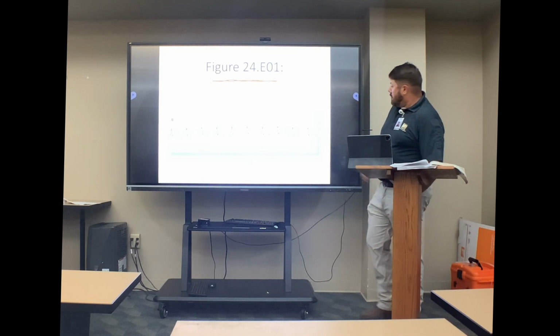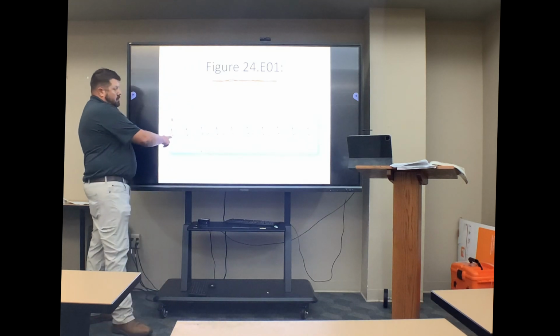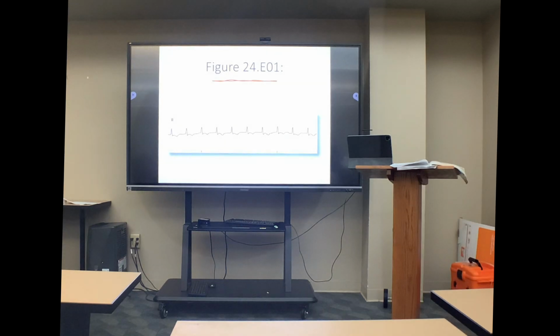Okay. So that's a 100 right there. Just for rates and stuff, to eliminate confusion: 40 to 60, say, junctional escape. 61 to 100, accelerated. 101 and greater is tachy. And that's what we're going to stick with, okay?